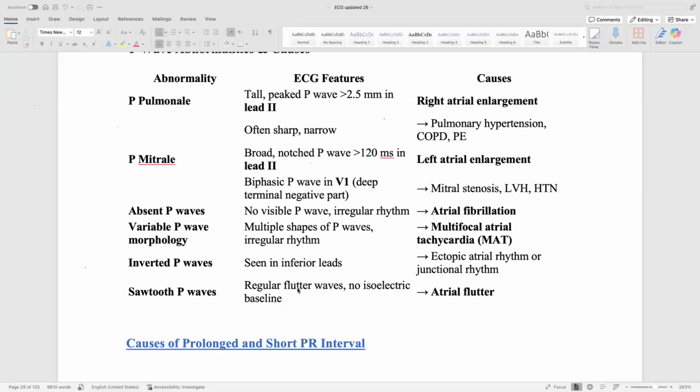Sometimes there are many irregular, abnormal rhythms, but it is not atrial fibrillation. Only an abnormal rhythm in the absence of P wave, here we can say this is atrial fibrillation.